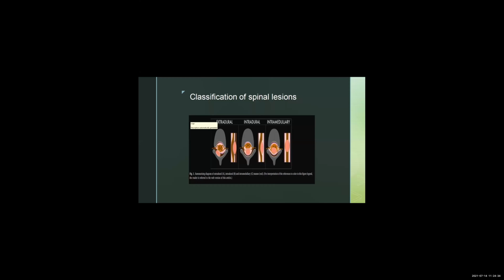So really CT and MRI, they're almost complementary. Almost think of it, whatever the CT lacks, the MRI makes up for it, and whatever the MRI is not good at, the CT essentially fulfills that role. A very good example would be bones. So that's one part.